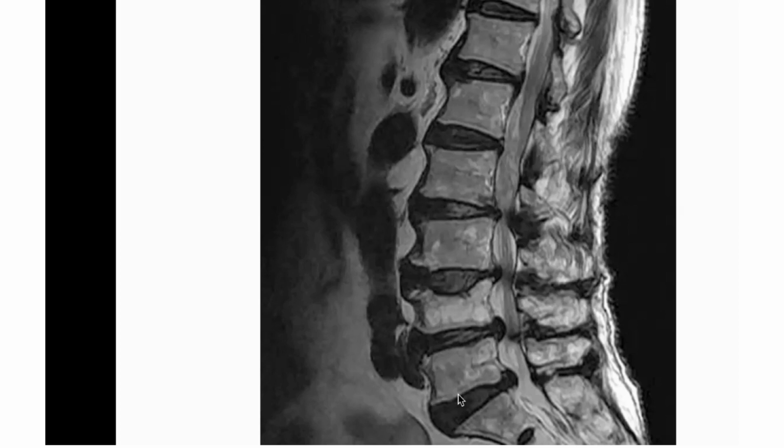Okay. So this is actually a patient. This patient actually came with a dorsal spine fracture. So we did vertebroplasty on him, but his lower spine was having all these pathologies. But he said, I never had any back pain, lower back pain. But look at the pathologies.